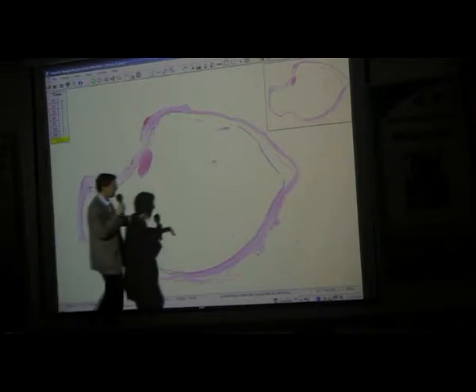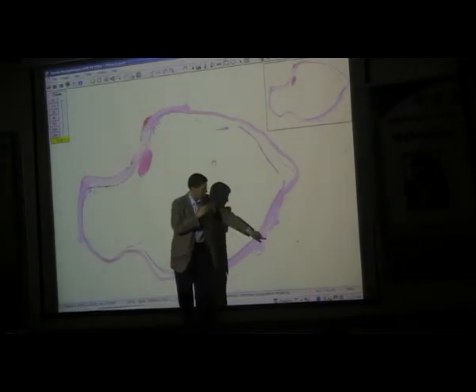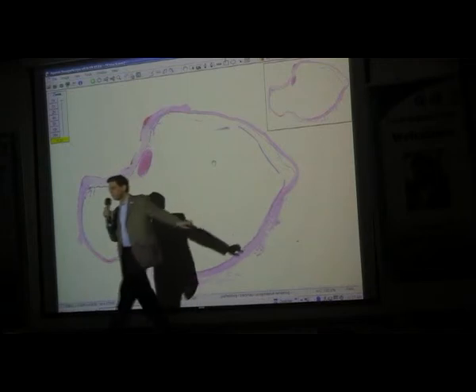If you have cortical atrophy of the brain, the subdural space widens. So the same thing happens in the optic nerve. When you have optic atrophy, here is the dura, and here is the dura, there is the nerve. You have a gap between the nerve and the dura, which is an indication you have optic atrophy. You've now made one diagnosis on the slide.